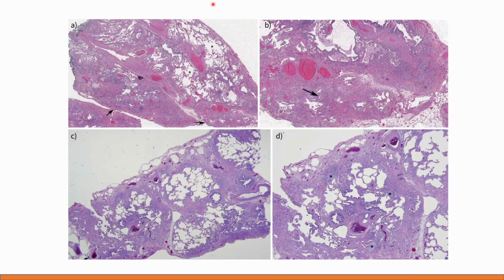And what can be appreciated here is also some honeycombing. So this, if you look closely, is the honeycombing that has been referred to, and this is juxtaposed with unaffected lung parenchyma. So when you see this, then this is the unaffected lung parenchyma, and I shall change my marker so that it's a little more visible.